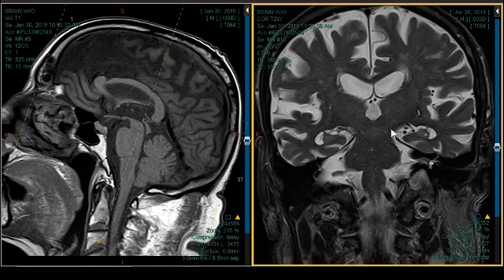I'm probably a little more aggressive than you are in doing that. If the history says cognitive decline or dementia, then I often give a differential. And in a case like this, I would use the ALZ word because the findings are so profound. I'd say favor ALZ over A, B, C, and D. No, I mean, if they already are demented, okay, that's fine. But if they've not been declared demented, it's hard for us who have never seen the patient to declare that. Clinically, I would never say it, absolutely. And, as I say, it may change things.